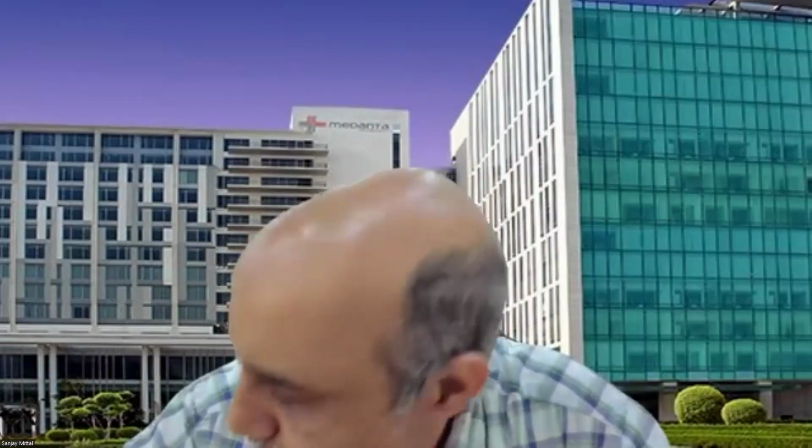Do you have any video for that, just to see? Not as of now, but obviously in my compendium I have a lot, especially when you go to the stress echocardiogram. You can imagine when the person has exercised, the heart rate is about 130, 140, the heart is contracting like that. You have to train your eyes at rest as well as on exercise to understand which segment has done pretty well, which segment has not. Once you do a stress test and dobutamine and all those things, all those ideas do come to your mind. Thank you, sir. Noted.